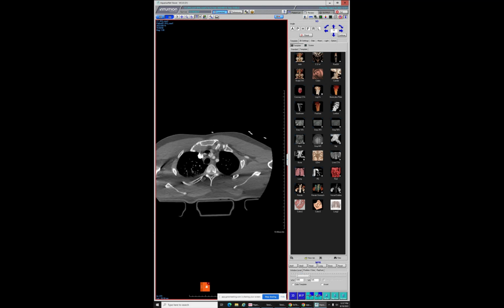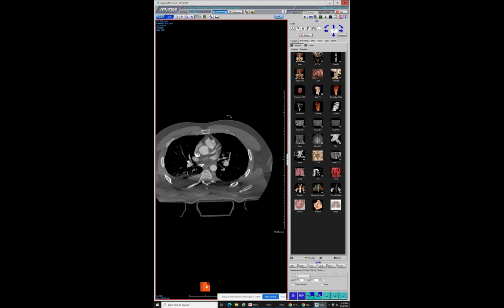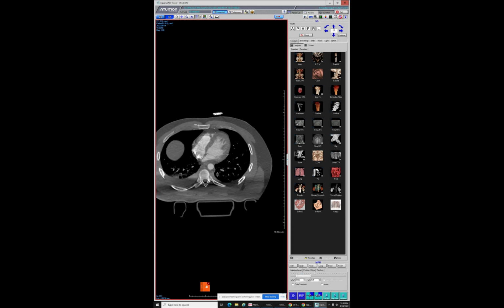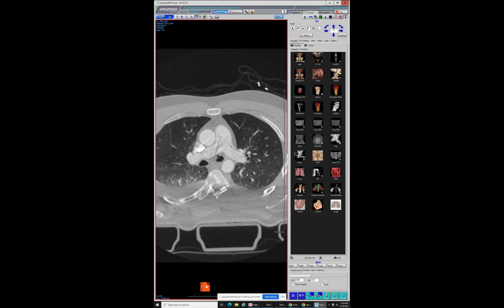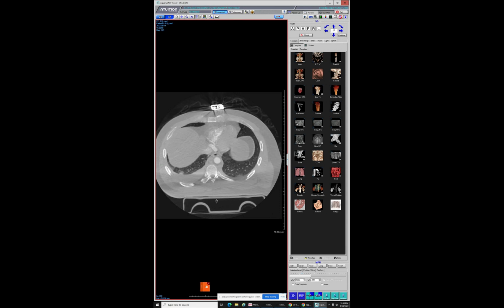And then here's air in the brachiocephalic vein and then air in the PA. So this was an open fracture leading to a decent amount of air embolization. The patient was asymptomatic from it, but I don't think I've seen that before. I was impressed. Anyways, I thought that was interesting.